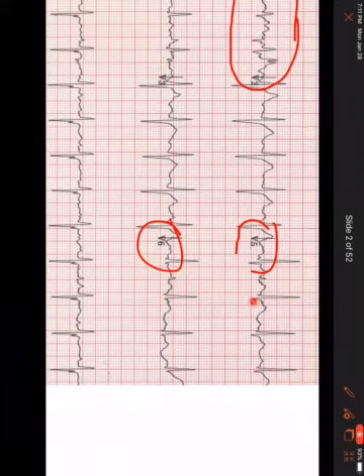We'll go to the second beat. Put my laser on the ST segment or the J point. Actually, I'm going to use this beat. It gives me a better isoelectric to look at. So there's my J point or my ST segment. As I move it straight across, I'm isoelectric. And V6 is a little tricky because we have a wandering baseline.